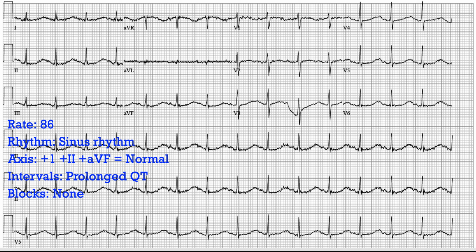So does that give us blocks? No, not specifically, but it does say we have a prolonged QT interval. All right, rate, rhythm, axis, intervals and blocks.